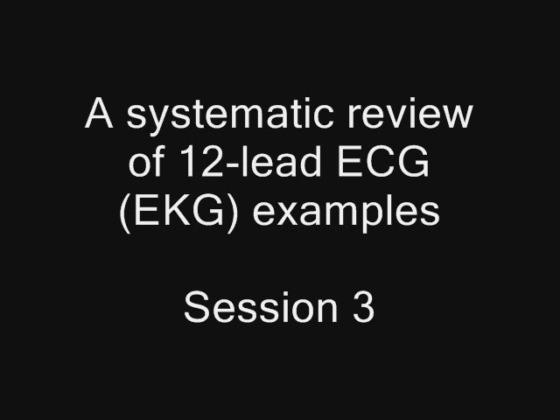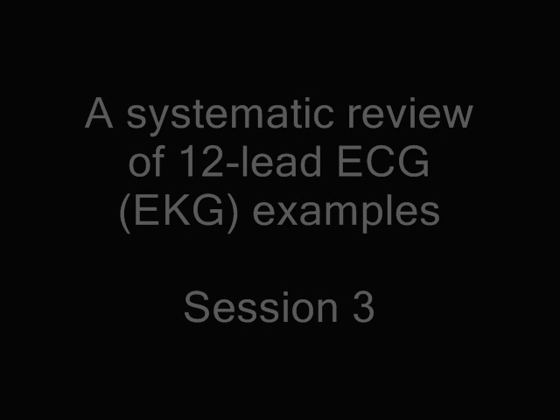As promised, I'm going to talk you through a series of 12-lead ECGs or EKGs utilising the systematic approach. Afterwards I've left a series of examples for you online that you can practice independently utilising the systematic approach, and you can have a look at my answers and information there as well. But let's stick together for the moment.